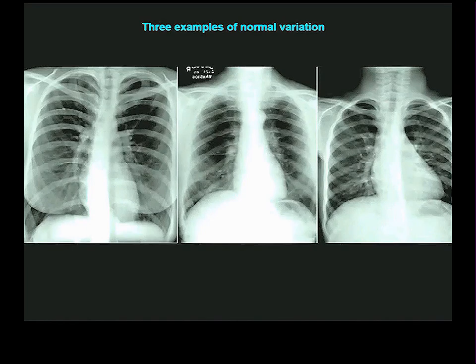And I won't go through all of these, but you can do this yourself. Very clear individual variation is shown in the left border of the heart. Let me go to the one which to me is most obvious. That big bump here at the top, that's the aortic arch. Here, it's a much smaller bump right there. And here, I'll be damned if I hardly see anything at all, just right there. People are like that. Some people's aortic arches shoot more to the left. Some people's aortic arches go mainly backwards, and they don't make a big bulge.